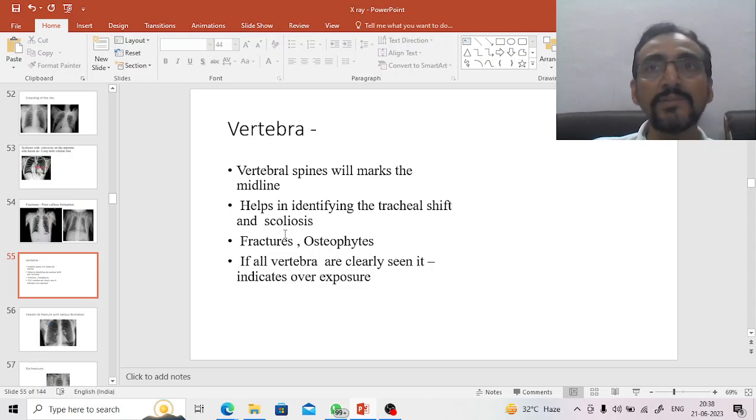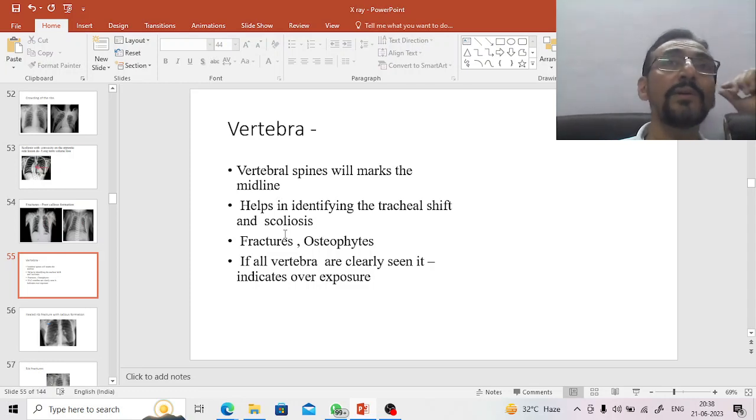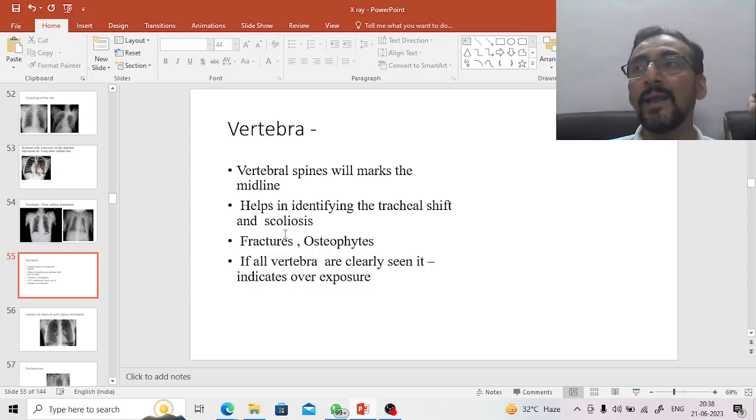हमें तो देखना चाहते हैं हम चेस्ट एरिया को, but अगर आप बहुत ज़्यादा एक्सपोज करेंगे, एक्सटेंशन करेंगे, बहुत ज़्यादा फैला के ऐसे खड़े हो जाएंगे, so क्या होता है कि बहुत सारे अनवांटेड चीज़ भी दिखना शुरू हो जाएगा. ठीक है, तो इससे हमें कंफ्यूज हो सकता है. अदरवाइज कोई दिक्कत नहीं है. If you are an expert x-ray reader, no problem. So if only few of the vertebrae are seen, then it is called as correct exposure.